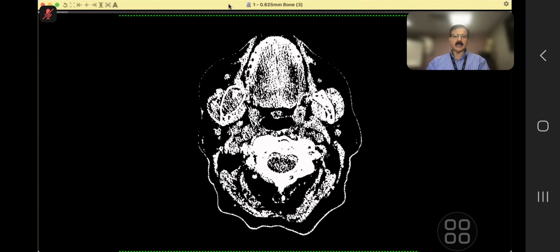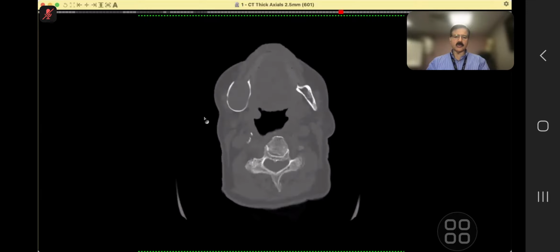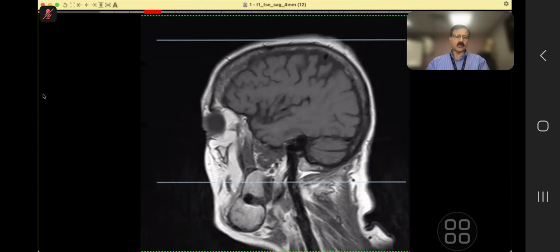We don't know. Of course, then we did a CT scan, and here it looks like an expansile unilocular lesion. It's not so bubbly or anything. But then on this CT also, it confirms. Will you stop there? No, you will not. The basic concept is, particularly because of the age of the patient, you have to make sure that it is cystic. Now, in this case, I could have actually given you a viva on an MR of the brain.